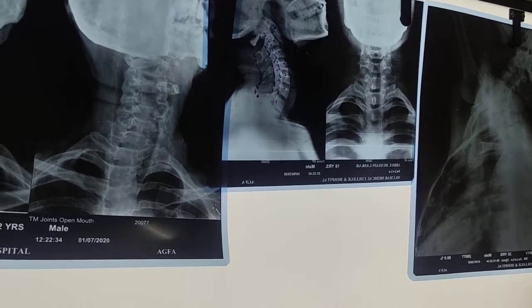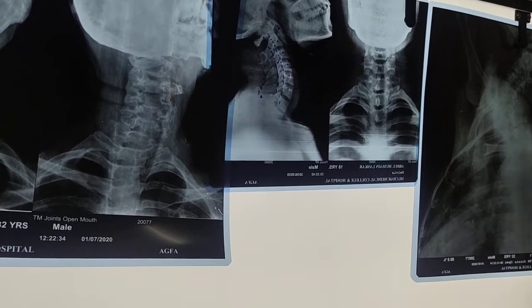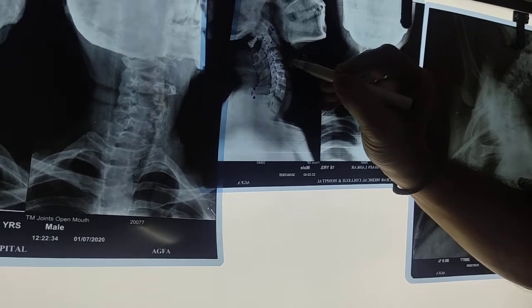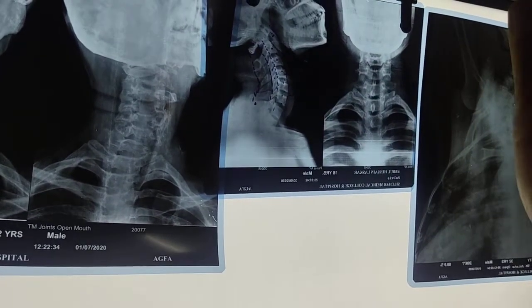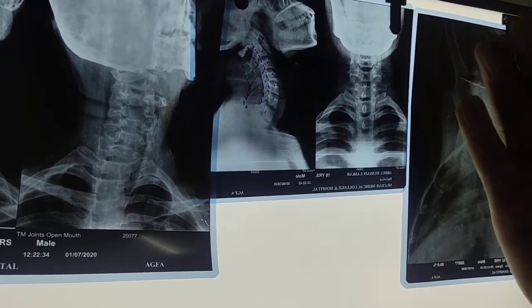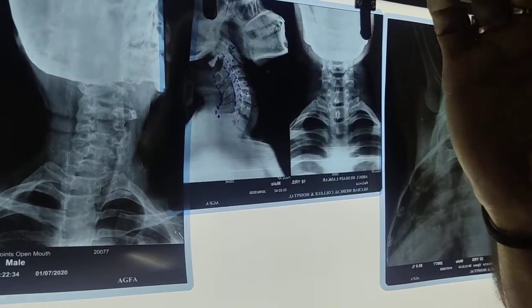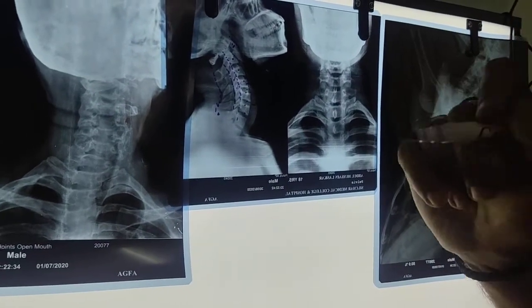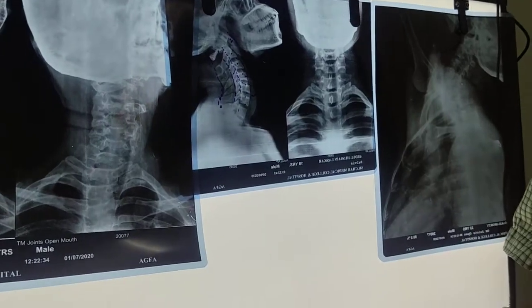And we have said about the C. C means your cartilage, meaning the intervertebral disc. The uniformity of the disc is very important. A reduction in a certain area, up to 1.5 mm, is very important. Usually it is 3 to 4 mm, right? So how it is coming down is indicated. That is one. And the degenerations, if there is any osteophyte and other things, are in D.